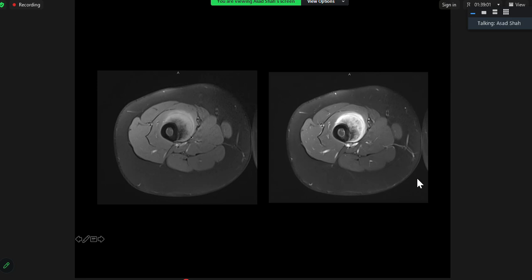Yes, and there's enhancement in a rind of soft tissue. As there's a large soft tissue component, I could think of Ewing sarcoma, as they have a large soft tissue component, but they're also intramedullary as well. The periosteal osteosarcoma arises from the inner layer of the periosteum. The inner layer seems fine. No, no, well, hold on.